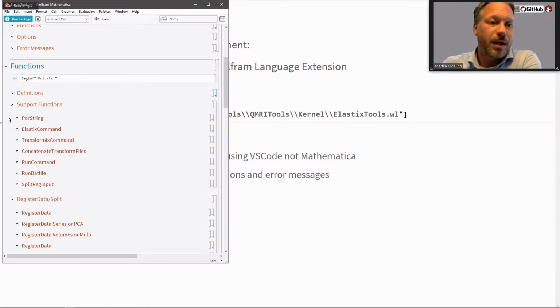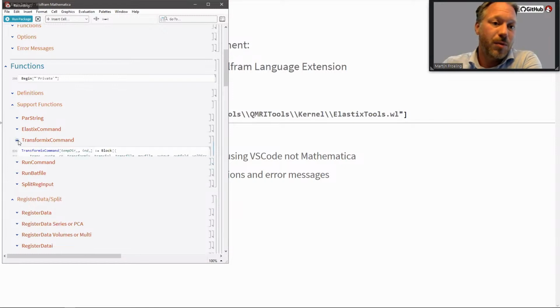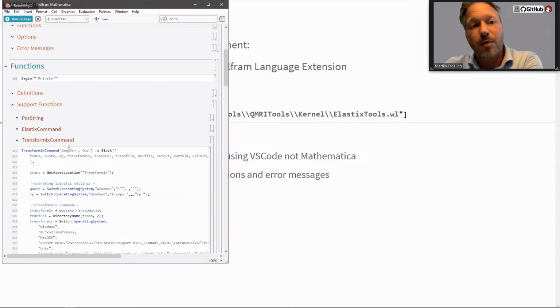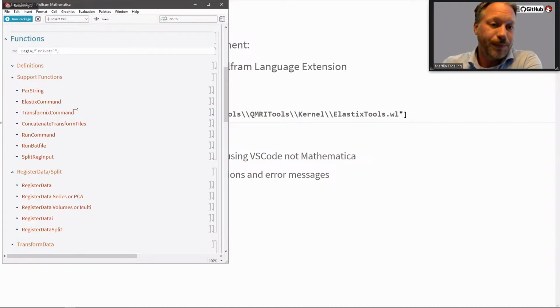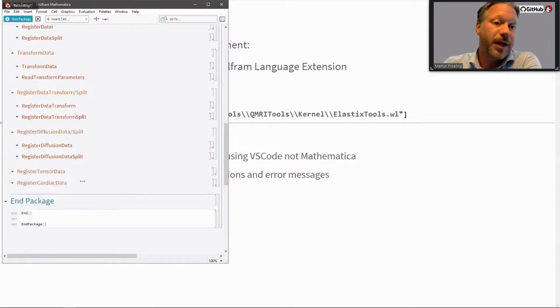You can see that everything is nicely grouped, and I typically use headings to say what's in there. I'm also quite consistent in commenting code because everything's online and I want other people to learn from it as well. So I'm typically trying to do quite elaborate code commenting. All the files have the same layout, and then, of course, I end the package.